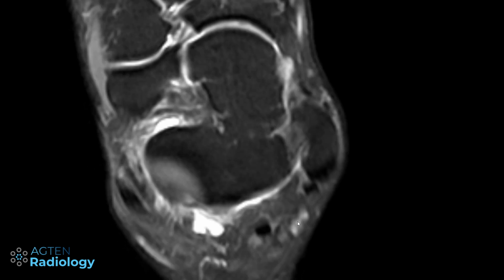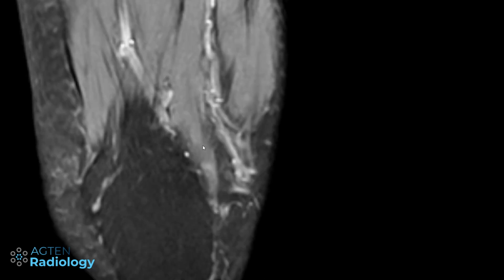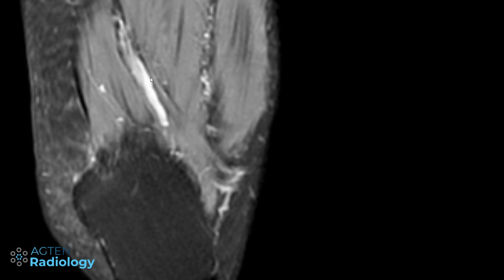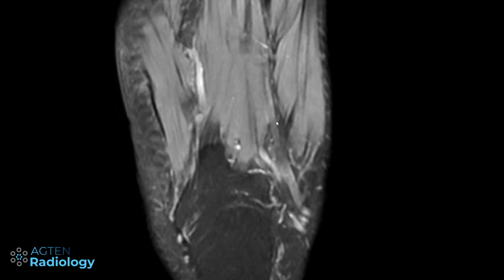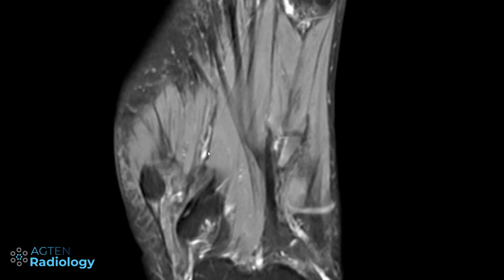Now, this posterior tibial vein splits up into the lateral and medial plantar veins. So we can see it now here. They go down, and then we see the veins here. This is the lateral one. We don't nicely see the communications going over here. So this one goes all the way down. That's the lateral plantar vein. And then we have the medial one, which is running through here. So these are the two, the lateral and medial plantar veins. And when we follow them more distally, at the level of the Lisfranc joint, like I said, they form the plantar arch.